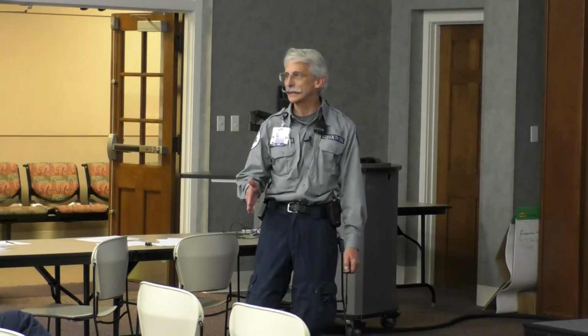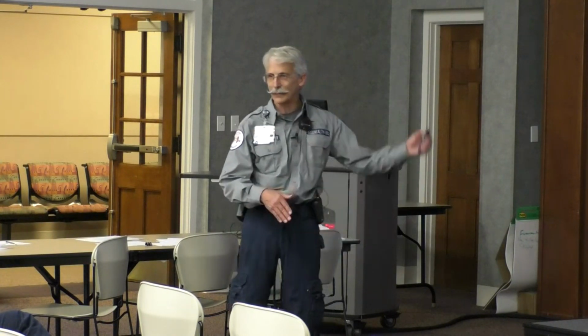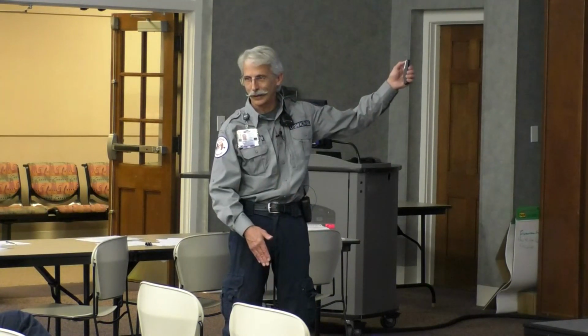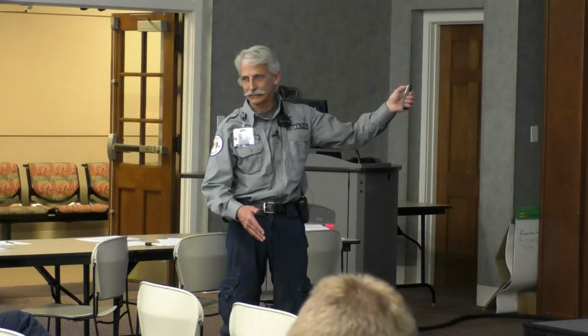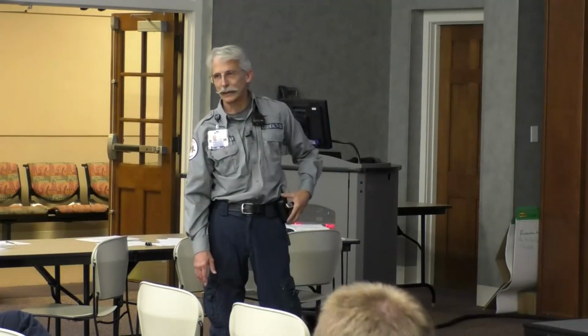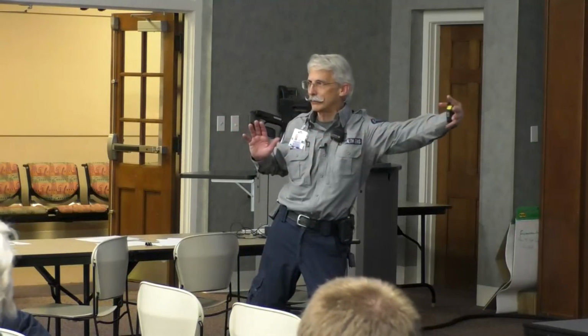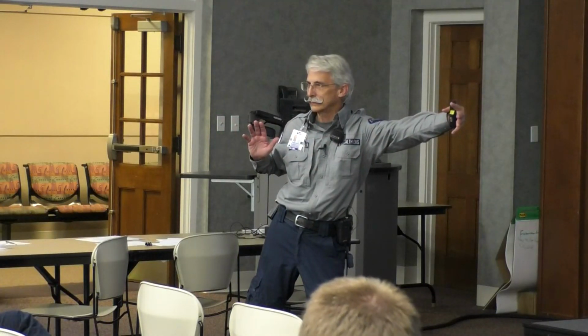I just want to be sure I stop in the same place, because one of them may have a QRS that goes up and one may go down. That would be the problem with doing it that way. But I just want you to understand this is one continuous time for this whole thing, okay?